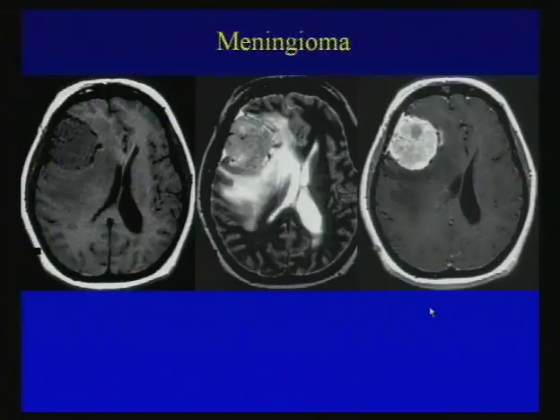These are all lesions that we think of when we see particularly a young patient with seizures. And here's an older patient with a new onset seizure. We see a typical extraaxial mass. There are vessels draping over the lesions.